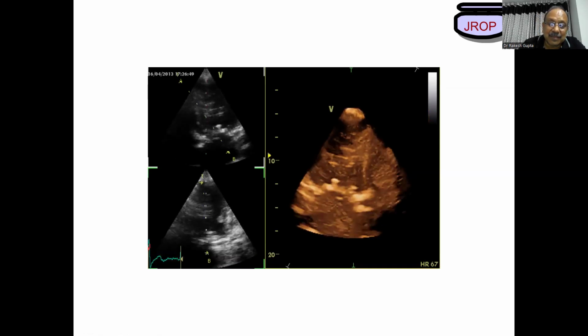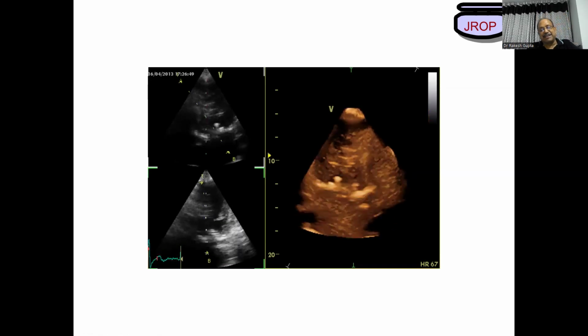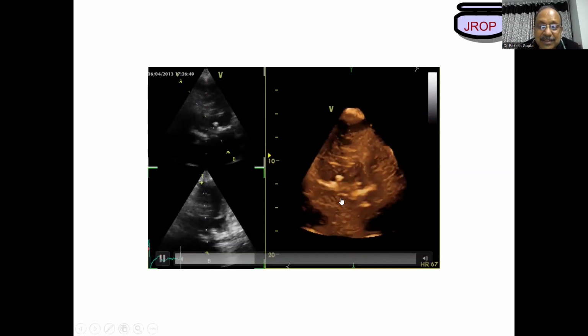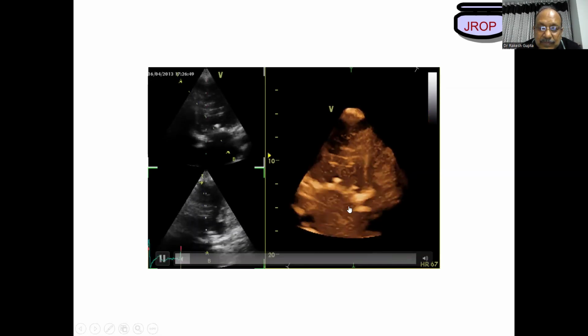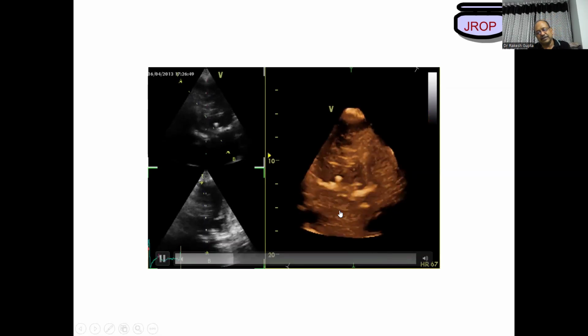Reverberations were very clear in case of mechanical. I was able to identify the metallic valve. But in this case, I was not able to differentiate. Actually, I was thinking it was looking similar, but those studs are exactly these. These are the studs, sir.